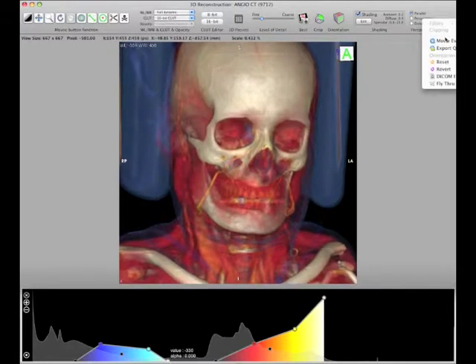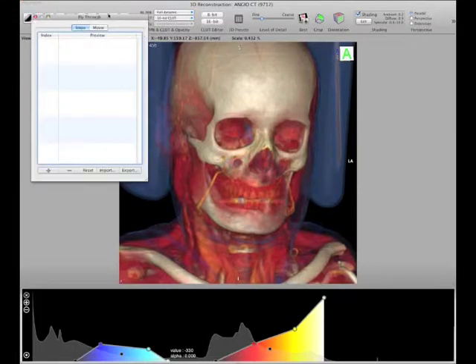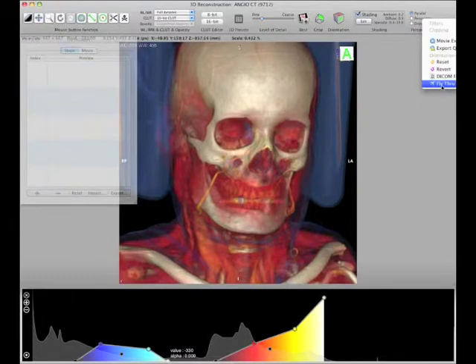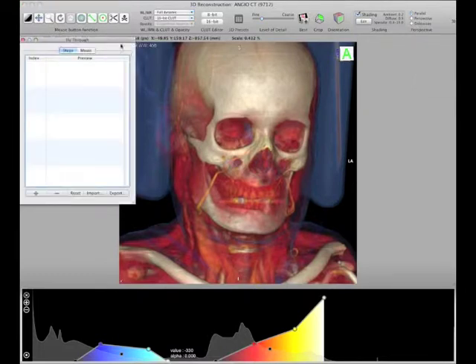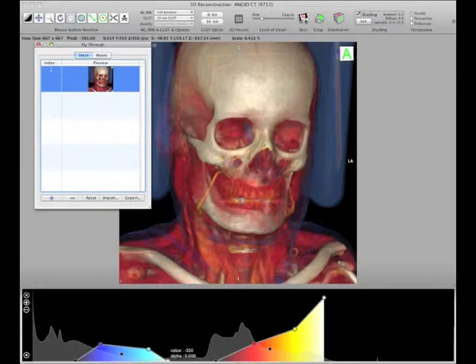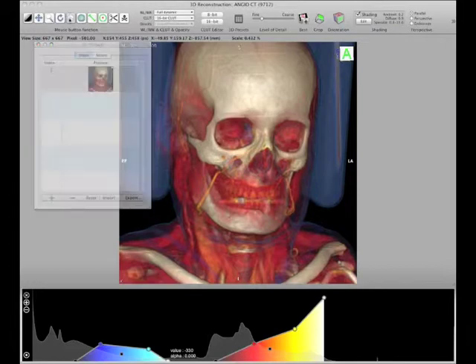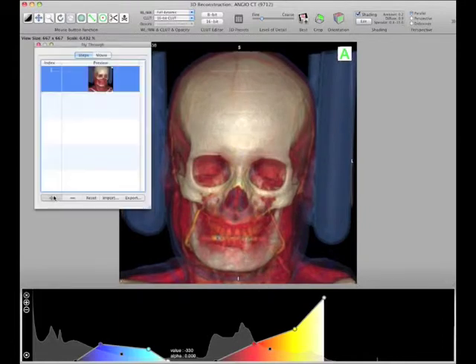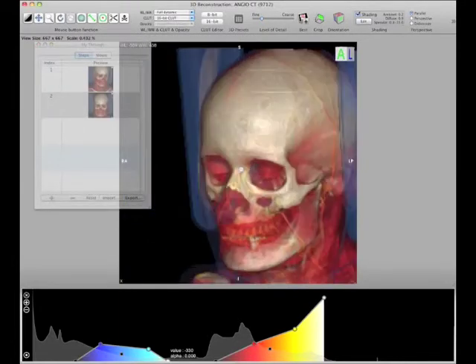And then I'd like for you to make a fly-through movie, and this is how you make a fly-through movie. Let's say we're going to make a fly-through movie where we rotated around and brought the crop tool in to crop out part of the head. What we do is we just bring up this menu from fly-through, right, and click a keyframe. Notice this keyframe matches where we are here. So it's just going to be a series of adjusting what we see in this window, setting a keyframe, and the computer will interpolate and export it as a movie. So there's a move and a rotate.